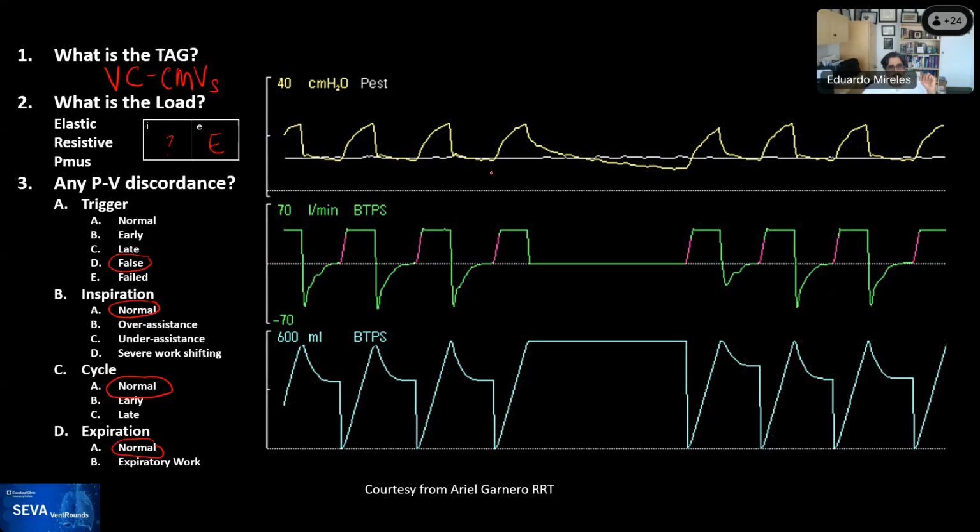So the first one, just going back to the elastic load and a manifestation of that elastic load, Mike, as you caused, is the presence of, you can see here, inspiration occurs, right? And then at the end, there's a pause. And you can see from here to here, that's called an inspiratory pause. And you know it's an inspiratory pause because the machine delivered the tidal volume, and then we did the pause, and there's no change in volume.